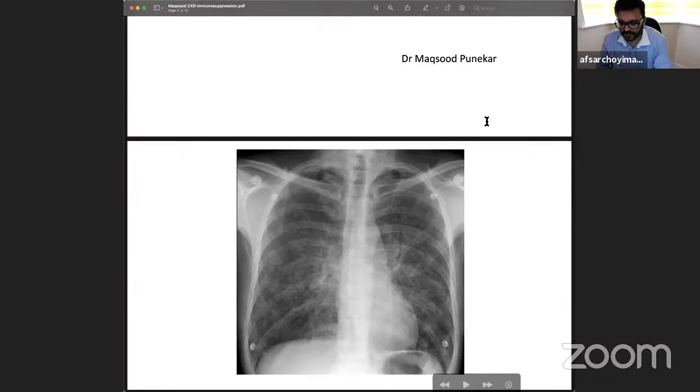Yeah. Okay. So in this case, if you're suspecting pneumonia, then of course you can repeat a lateral X-ray, because the heart should be clear here. You'll see a band of opacity there that will confirm. So for middle lobe pathologies, if you're not suspecting cancer, you can use a lateral X-ray. And that gives confidence that you're not wrongly treating a pneumonia.